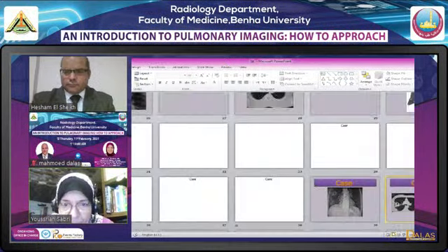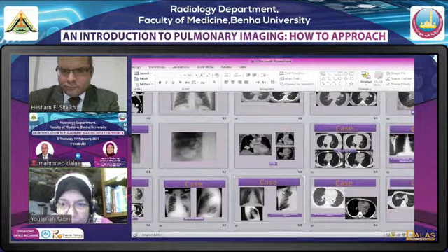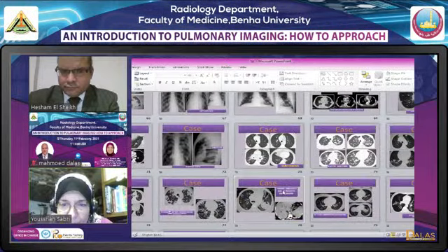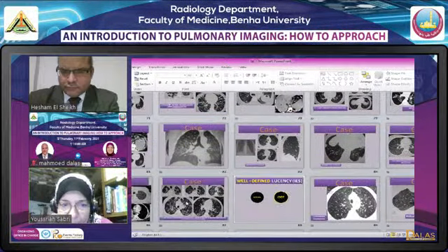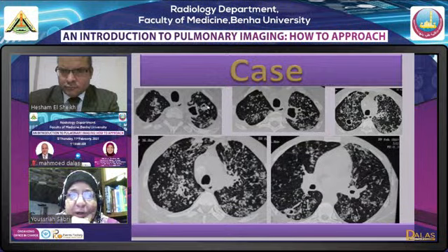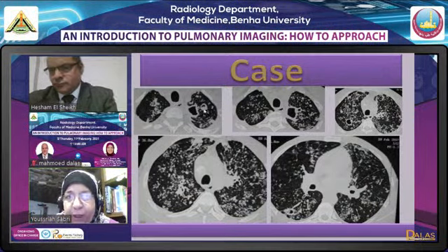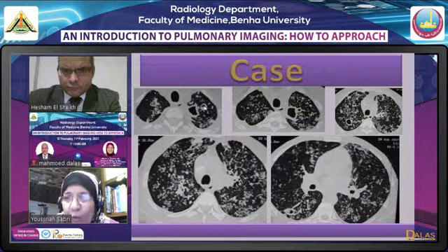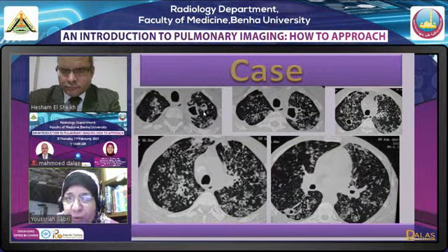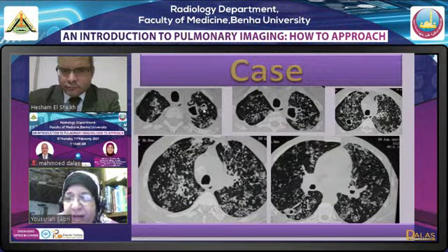لحظه واحده. نبص حضرتك هنا على الليجن اهو، في مايسيتوما. الوول اخبارها ايه؟ فيري سموث. اليومن سنترال وكريسنت شيبت، عامله زي الهلال، عامله زي المينيسكس. يبقى اليومن الاسود اللي عندي مينيسكال شيبت او كريسنت شيبت. سبب هذا الكريسنت شيبت ان في فيلينج ديفكت انسايد.